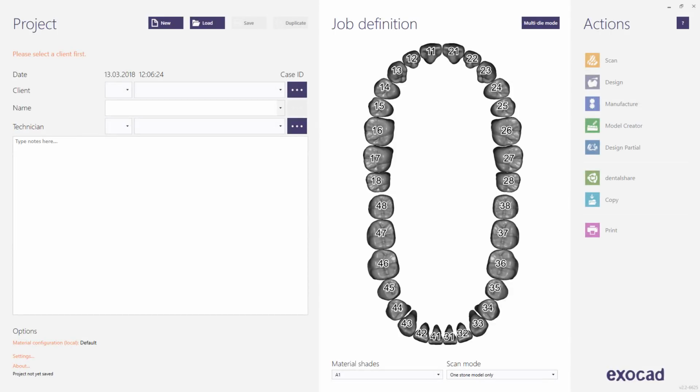This video tutorial from exocad will show you some of the new functions of exocad's new release, version 2.2 Valletta. With more than 30 new features, as well as 130 enhancements to existing functionality, the Valletta release represents the largest expansion of capabilities in exocad's history.